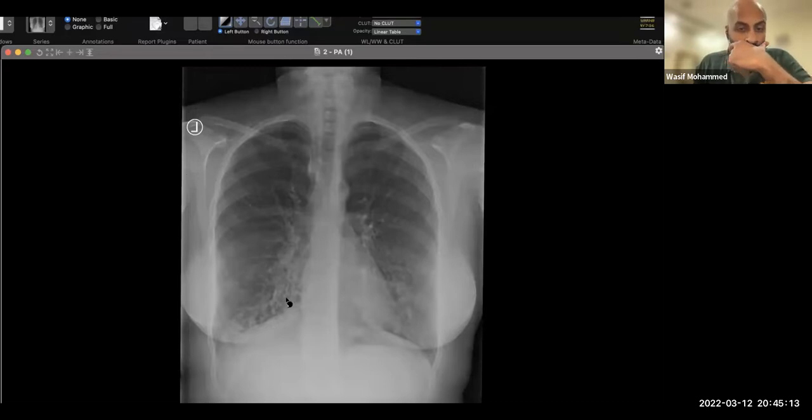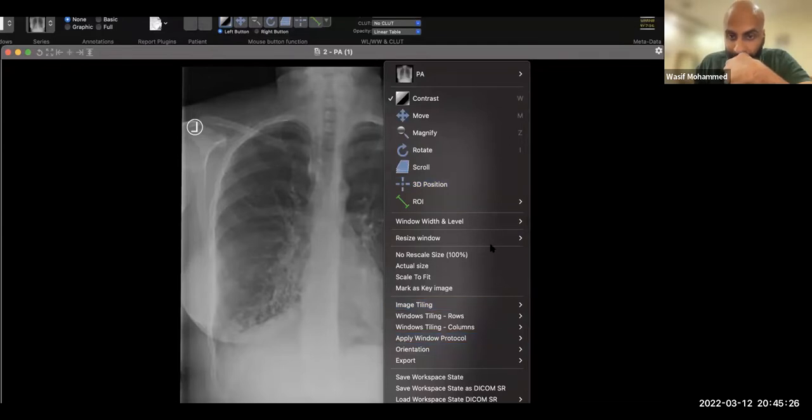So if the image was shown like this and you picked up the image marker and it was flipped, then right away you'd know there's something fishy going on. The description was on point. Dextrocardia. So let's just flip the image back up. You flip it. Yep.